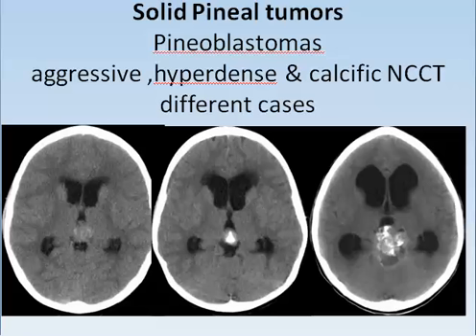You just check the anterior encroachment on the third ventricle, the posterior encroachment on the superior cerebellar cistern, and the presence of hydrocephalic changes with CSF permeation. And you have to describe the heterogeneity or calcifications.